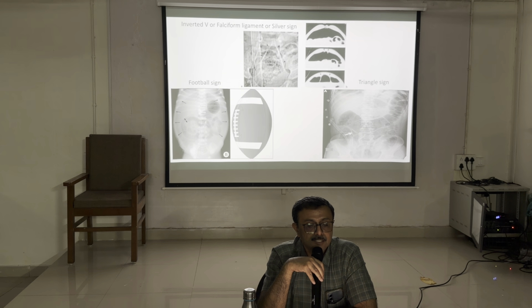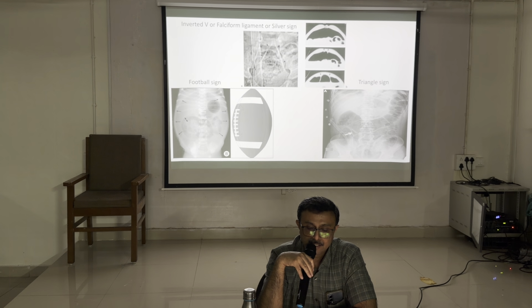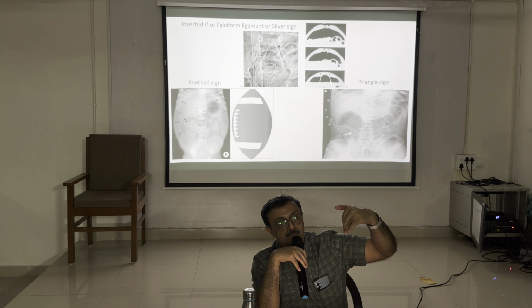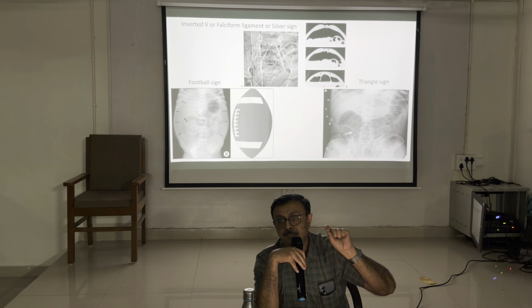Other signs include falciform ligament sign, football sign, and triangle sign. So when gas is liberated, triangle sign. Triangle sign is in the loop. Gas is entrapped in the loop.